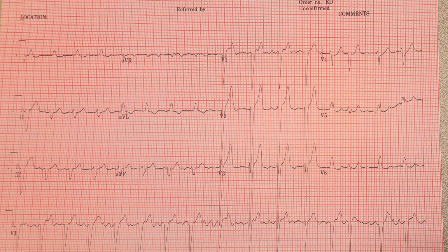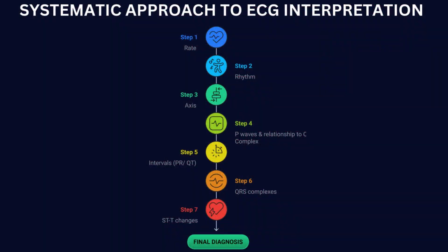Please follow the systematic 7-step approach. You will get 10 seconds for each step. You can pause the video if you need more time. Please write down the answer. I will discuss the result in detail near the end. Let's get it started.